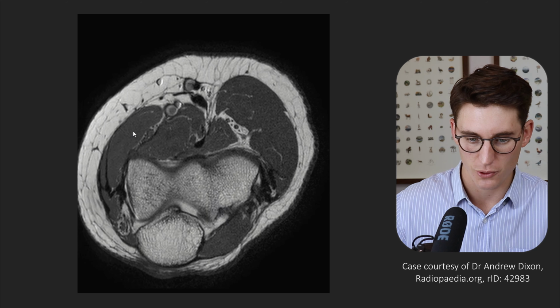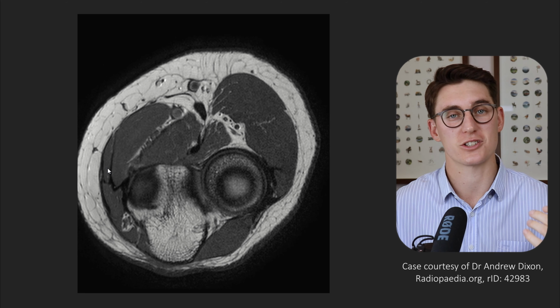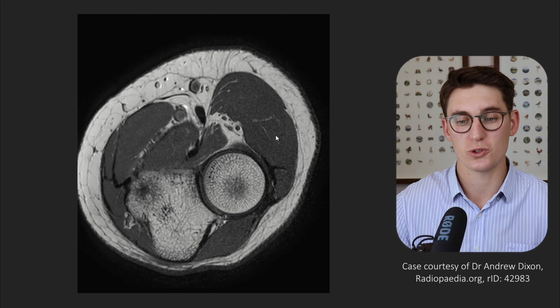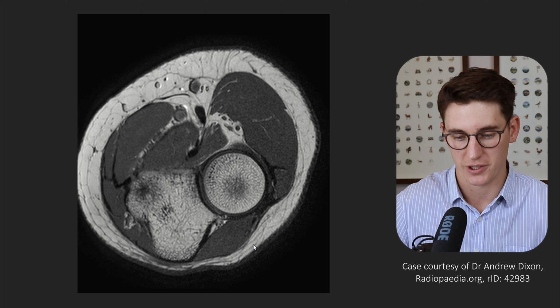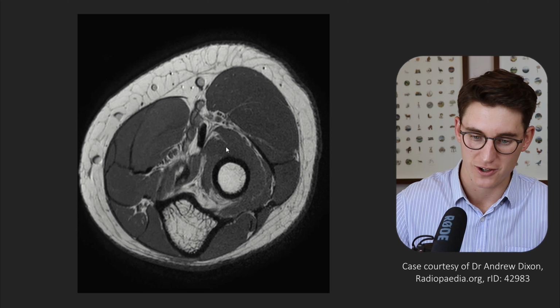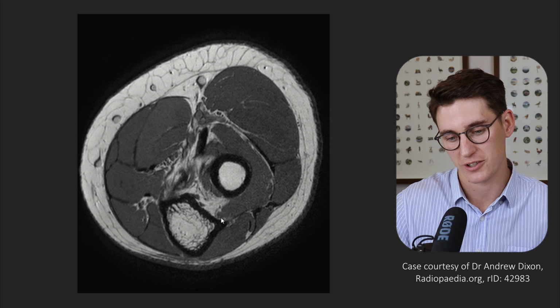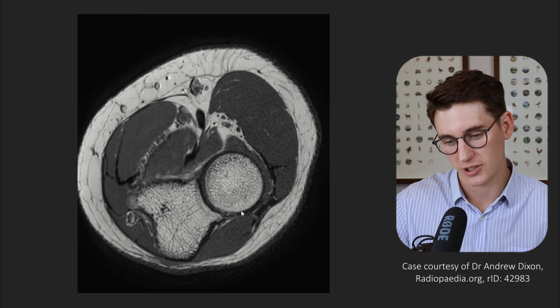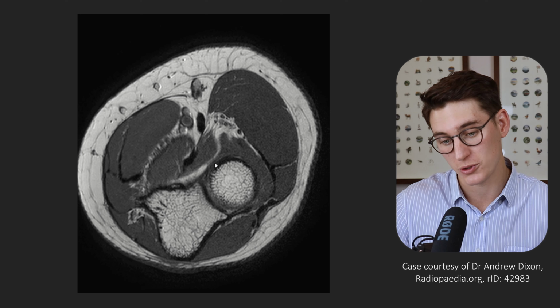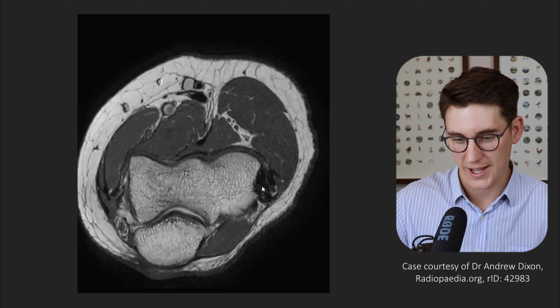On the medial side here, we can see our common flexor tendon origin, which gives rise to those 5 muscles, our pronator teres here, our flexor carpi ulnaris, flexor carpi radialis, our palmaris longus, and our flexor digitorum superficialis muscles. Now, it's not necessarily important to remember all of these muscles. Some of them have a distinct appearance, like the anconeus, like the large brachioradialis, and like this muscle that wraps around the radius here as our supinator muscle, coming from that supinator crest that I talked about earlier, where our lateral ulnar collateral ligament, you see it coming there, wraps around the posterior portion of the radial head here and then heads up towards our lateral epicondyle.